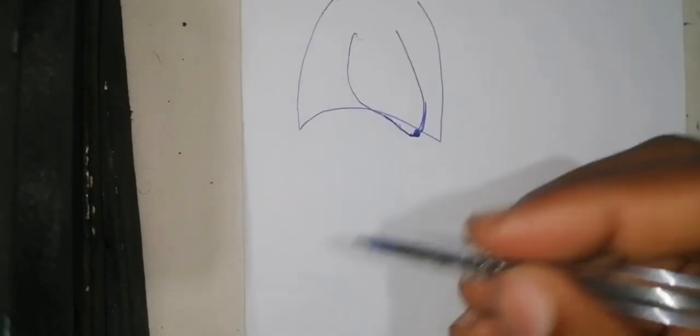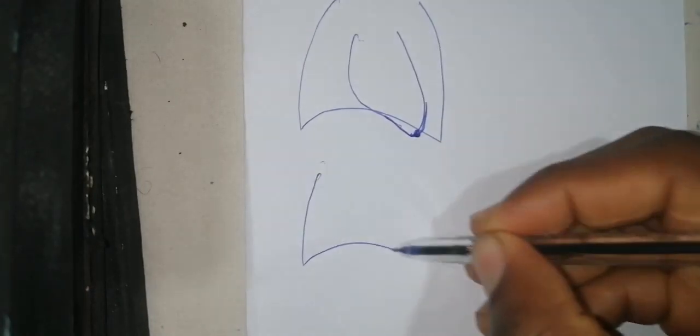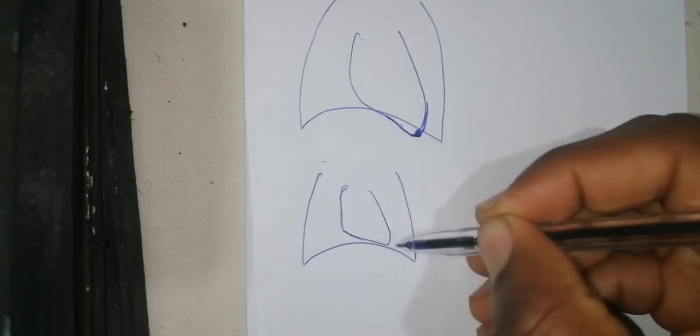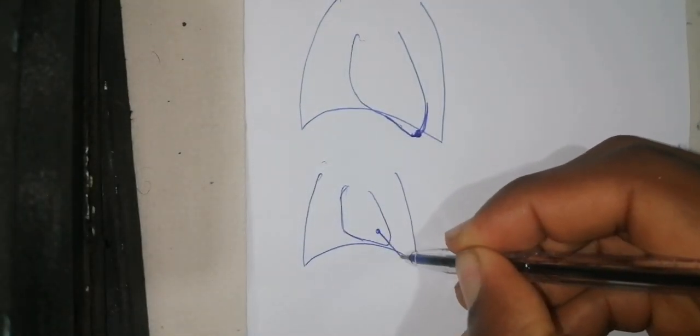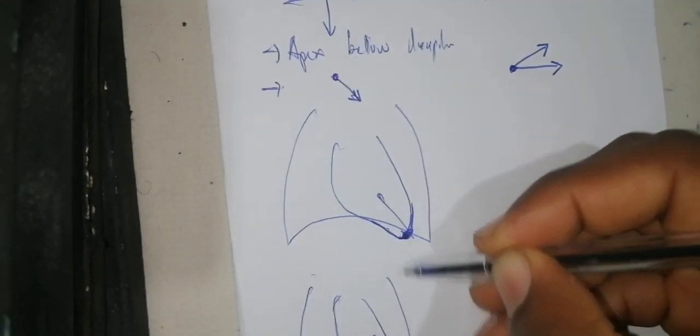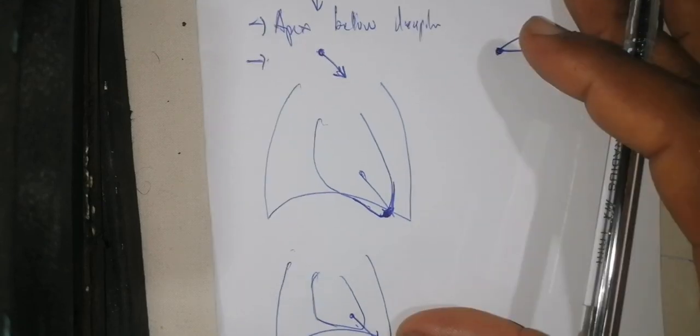Is it clear? So what do I mean by that? If you have measured the cardiothoracic index, this is the normal shape that the heart should resemble. Now, if the heart goes in this direction, you see that it's going to take this morphology that was up here, and the apex is going to be below the diaphragm, the left diaphragm.